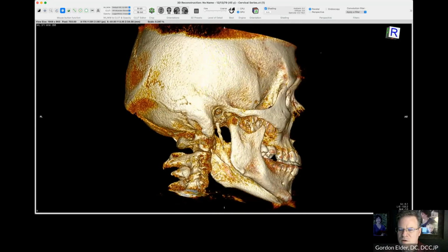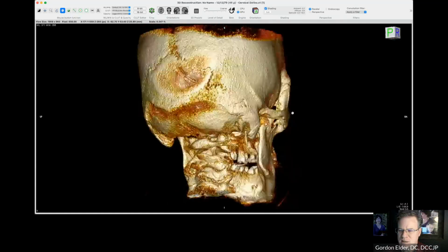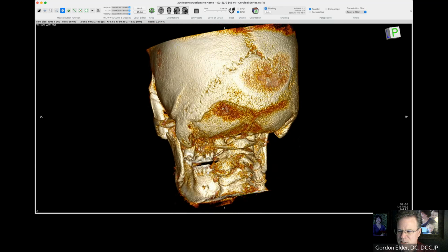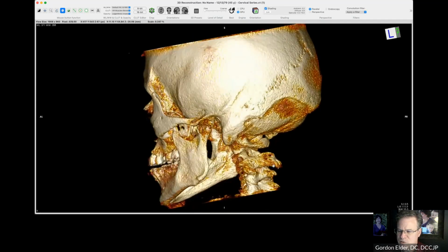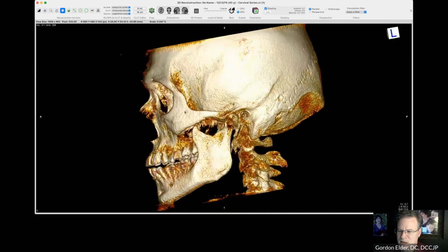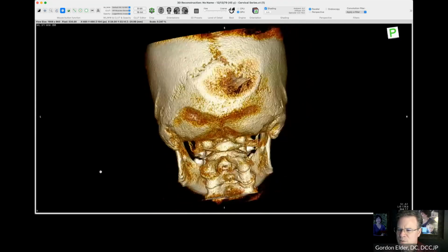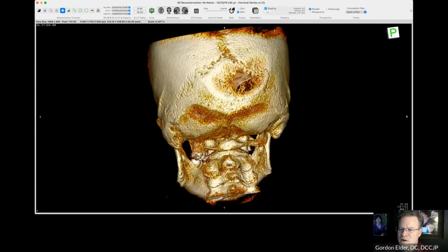However, I do like overlooking it. I like looking at the styloid processes, how close they are to the transverse processes of C1, and the arthritic changes, like you can see here between C2 and 3 on the left facet. Overall, things you just might need to know to get an overview.